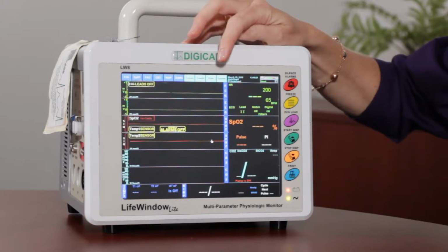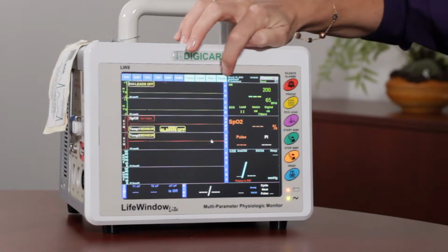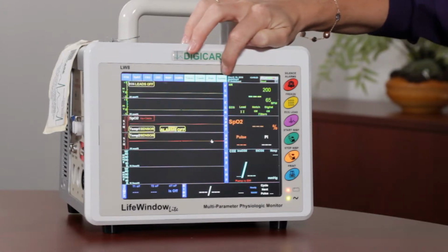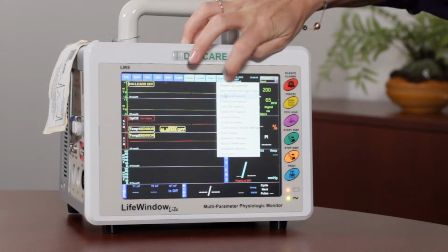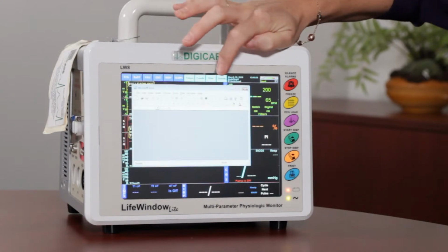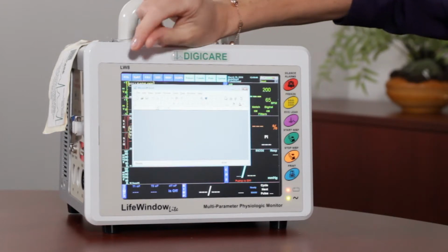Now we're going to view Reggie, our patient, that we saved as an Excel report. There are a lot of things under System, but right now I'm focusing on how to view the Excel report. You just want to hit System, View Excel Reports, and this looks very similar to an Excel report on a computer.